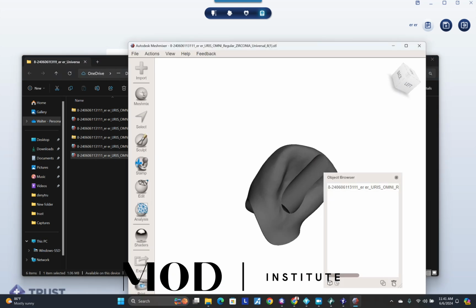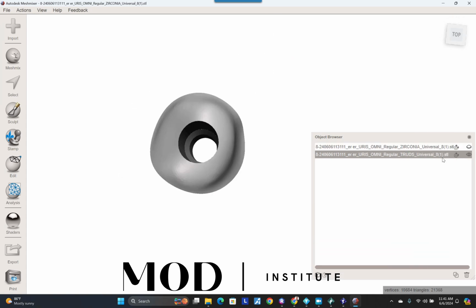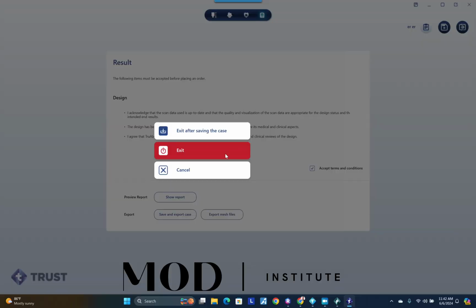It's open. So here's my crown design with the screw hole, and there's my abutment, which I've turned into a little custom healer there, a little button that could then be printed and screwed in. Now, some printers don't print that hex really well. Use at your own risk there.